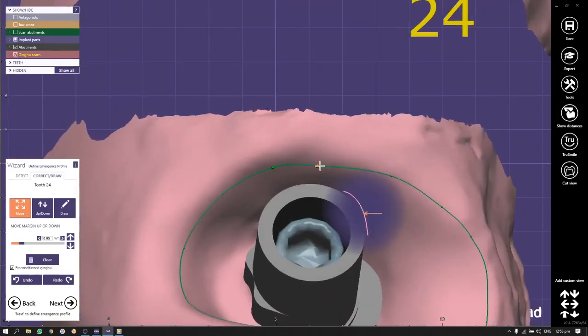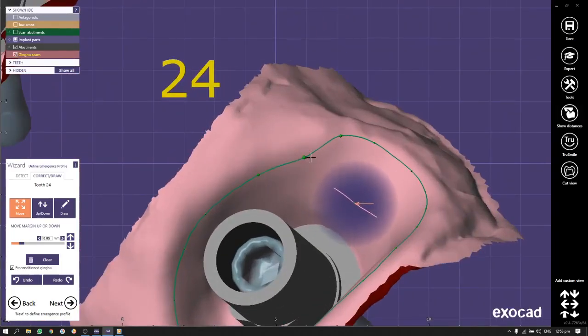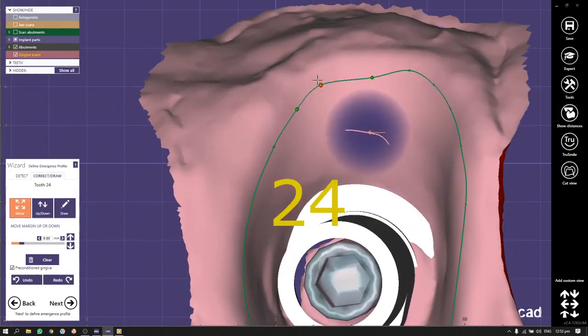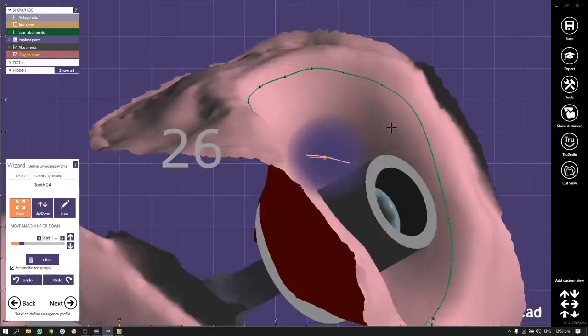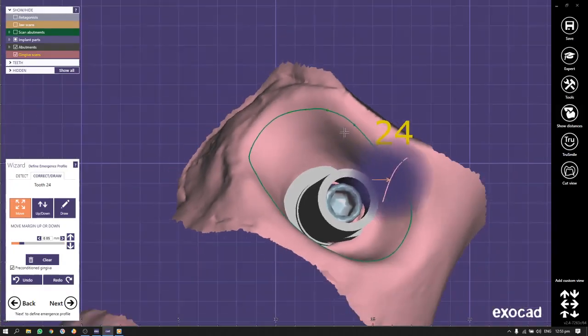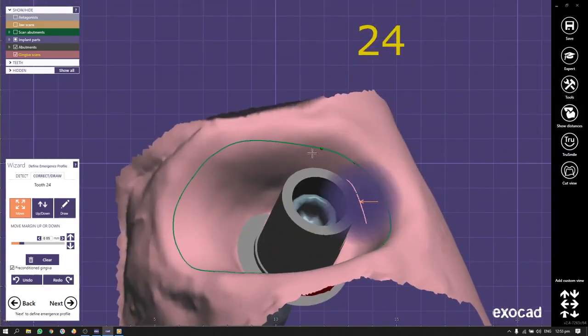Very often customers ask us to leave from the palatal side the finish line at the level of the gingiva, so not to place it too subgingivally. So during the cementation it will be easier to remove the excess of the material. Sometimes I do for anterior teeth lowering 0.7 buccally, 0.3 proximally and 0 on the palatal side.